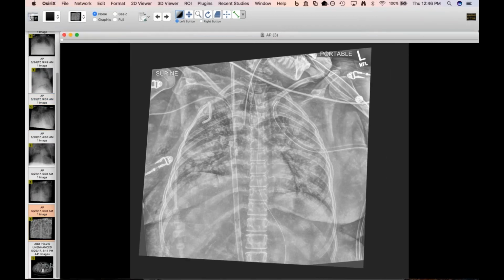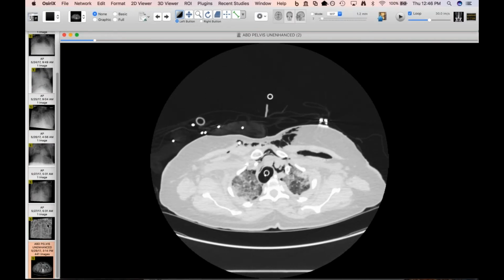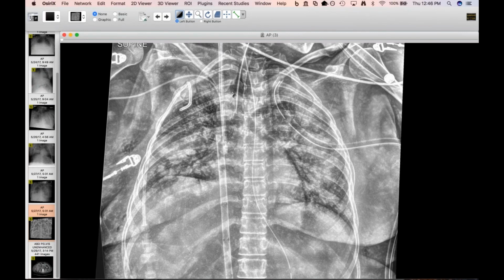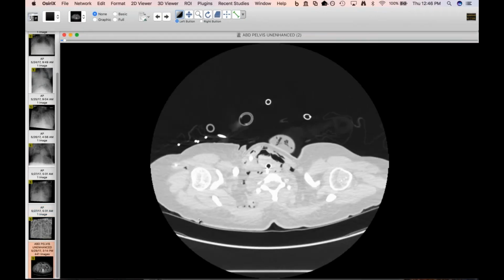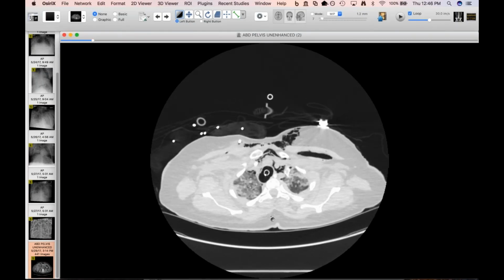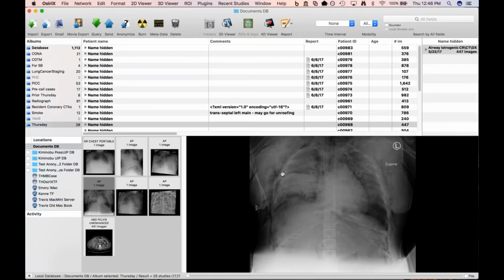Travis, do you think you're actually seeing the bulge in the air column on that last radiograph that you had up? Oh yeah, on this one, yeah, right here, yeah, probably. Yeah, you're exactly right. Along the right aspect of it. Yeah, right posterior. So, I don't know. Have you guys seen this before from a balloon on CT? I mean, we've seen it discussed on radiographs before, but not sure that I have.